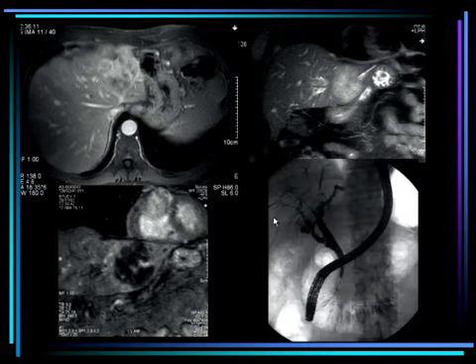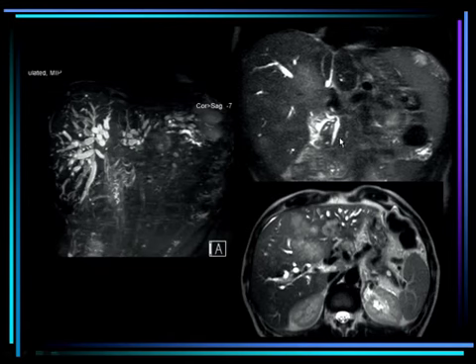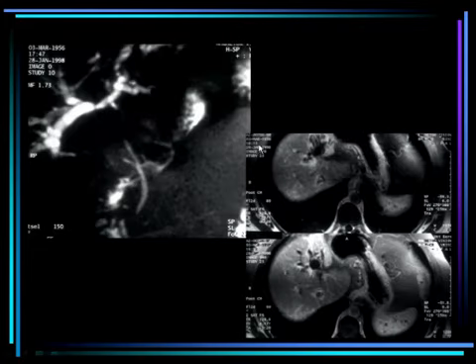And the most important thing is that in the intrahepatic case, you don't have changes by ERCP. There are some changes here because of another reason, but for the intrahepatic form, you don't have changes by ERCP. So intrahepatic form, centrally with dilatation of the bile ducts, cholangiocarcinoma. This is the extrahepatic form.